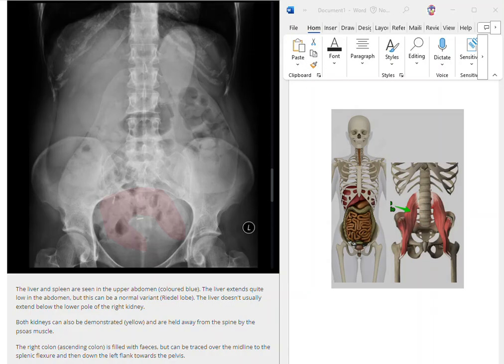So if we hit the patient with a central ray that's anterior posterior, meaning it enters the anterior and exits the posterior, to know that we've penetrated all the way through the patient, all the way to those psoas muscles, we'd be able to identify the psoas muscles on the x-ray. So that's one of our challenging things to do, is find the psoas muscles on our x-rays to make sure that we've penetrated all the way through.